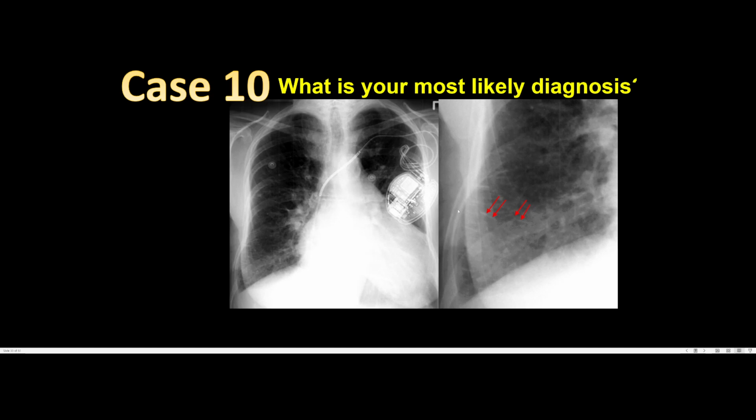And especially with cardiomegaly, we might also assume this might be interstitial pulmonary edema. This is another differential diagnosis. So this could be interstitial pulmonary edema. We might be in the early stages of heart failure, or this might be a case of interstitial lung disease with reticular pattern, all right?